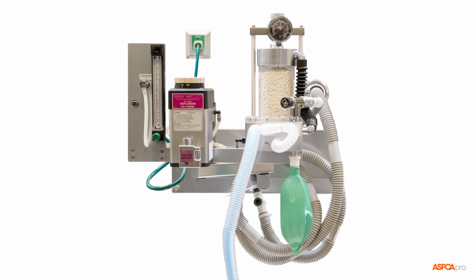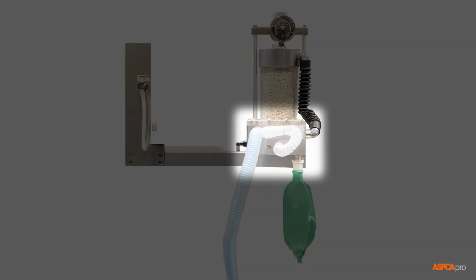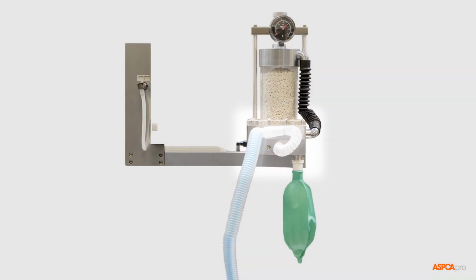Most of this occurs in the manifold area of the machine, but we can see on this image the blue tube cased inside the clear tube of the breathing circuit. Fresh gas to be inhaled travels down the blue section, and the exhaled gas travels up the clear section. These exhaled gases warm the inhaled gases of the inner tube as the patient breathes. Then it gets cleaned of carbon dioxide and can travel to the reservoir bag and back to the patient through the manifold.